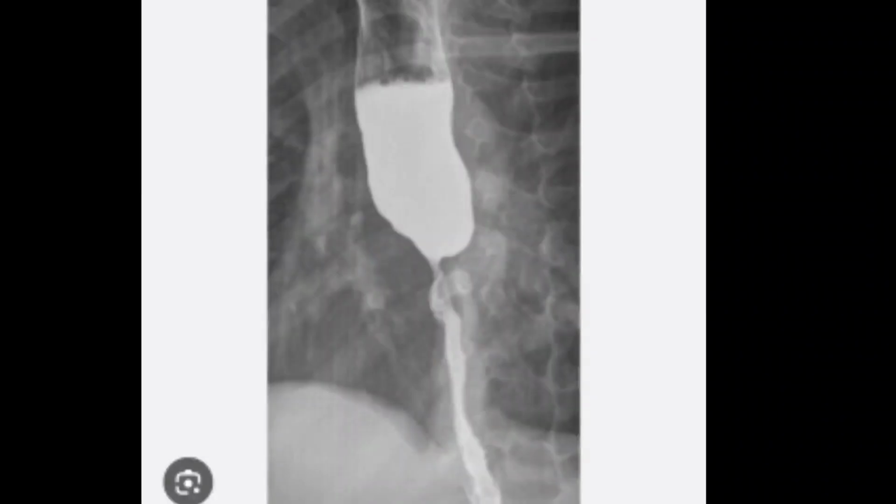This is the barium study, and on this study you can appreciate that the lower esophagus has a stricture, but this stricture is benign in nature and shows smooth walls, although you can appreciate the pre-stenotic dilatation. This is a clear example of the corrosive stricture, and this is benign in nature. You can appreciate that there is no wall irregularity, there is no granularity seen. However, pre-stenotic dilatation can be seen because of the stricture. So this stricture is called a benign stricture.